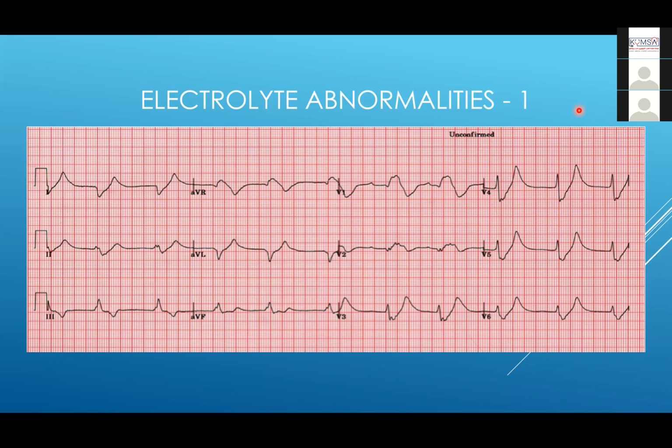Can we say that this is normal rhythm? What did we say was normal rhythm? We said P waves before QRS, and a QRS after every P. So is this a normal rhythm? Not normal. Why? There's no P wave before every QRS. Good. It's not that there aren't P waves, it's that you don't see them. They're flat. If you look at V1, there's a little P wave there. So in V1, you can see the P waves.